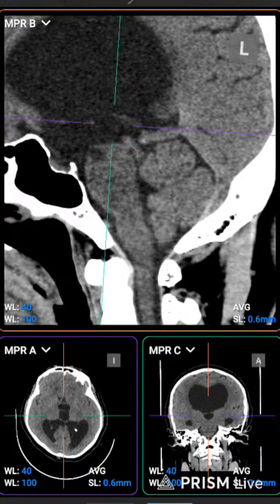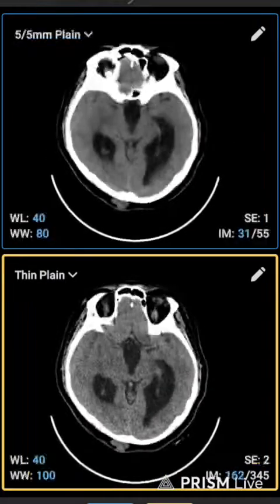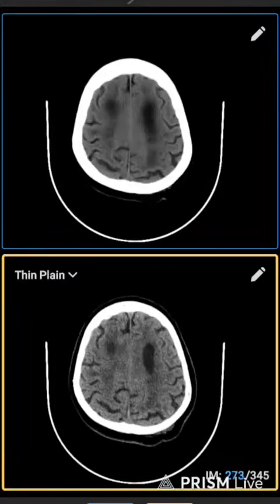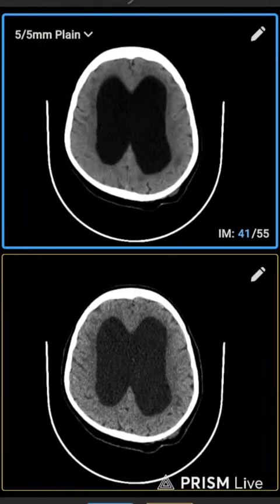So we get back to the next topic. It's important because if you see that type of patient, it's because of this problem that the brain was dilated. The ventricle was dilated, or it's called hydrocephalus.